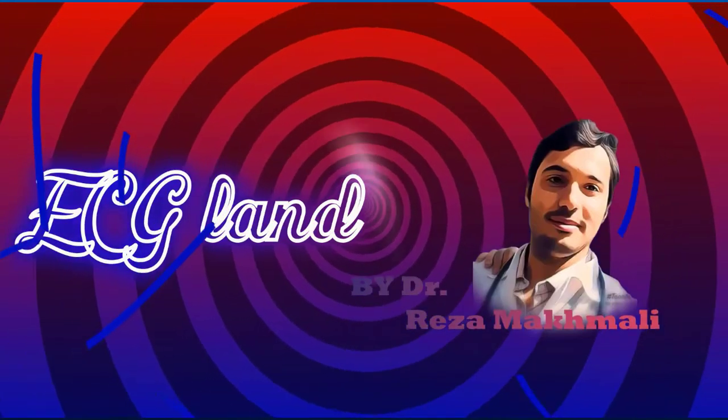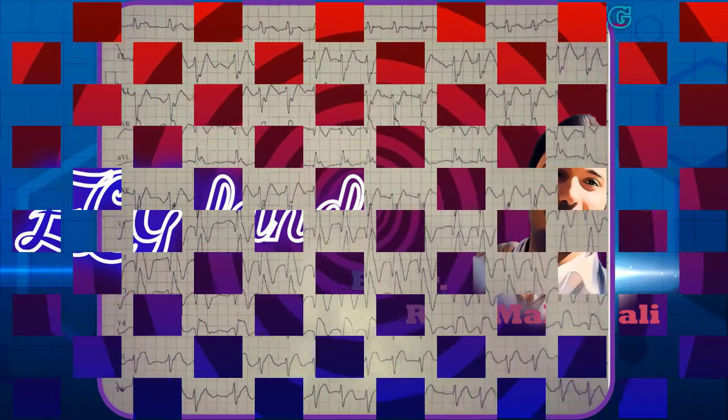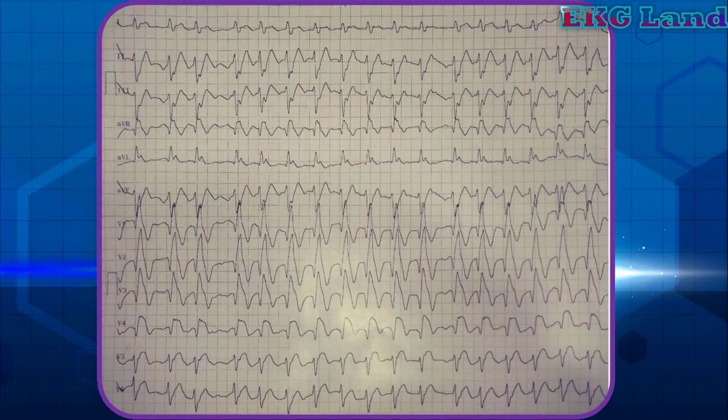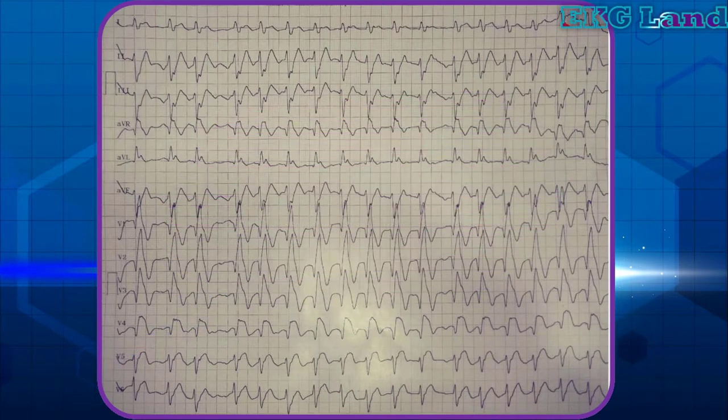Welcome back. In this video, we are going to have an ECG quiz. This is our today's strip, which belongs to a 75-year-old heavy smoker, presented to the emergency department with retrosternal chest pain and diaphoresis since 3 hours ago. An EKG was obtained. What do you think about this strip?